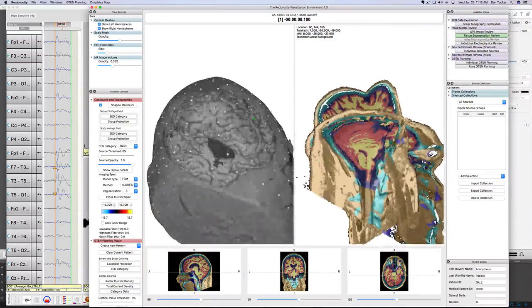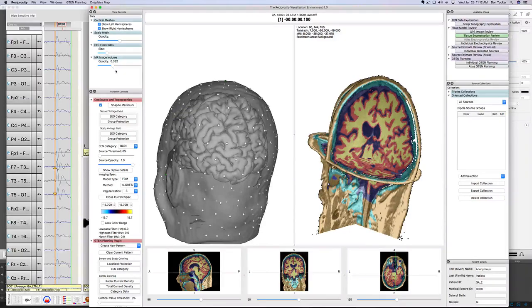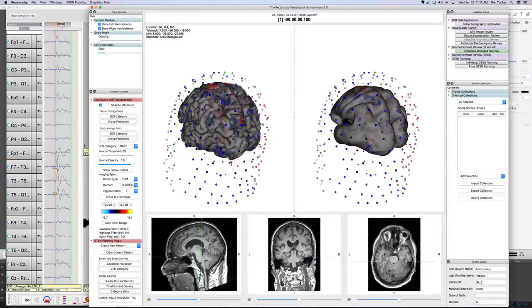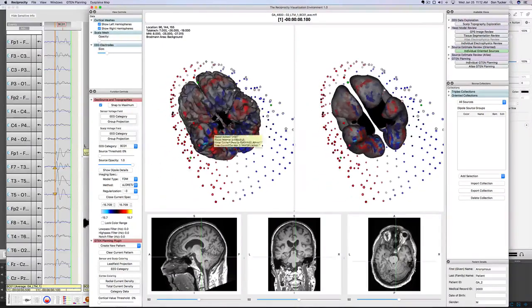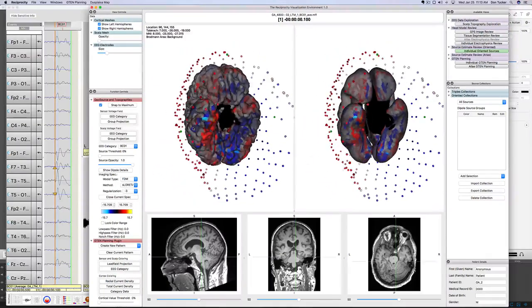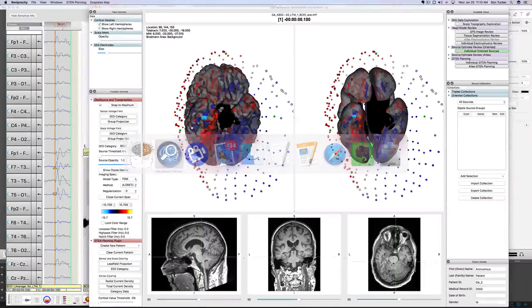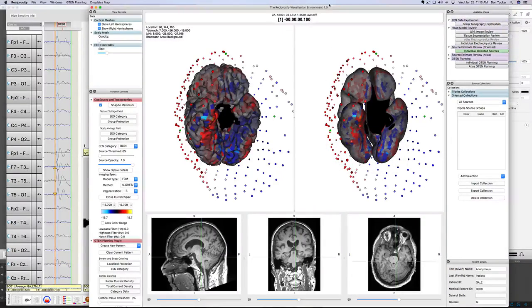the brain. Once we validate the tissue segmentation and the exact electrode positions, we can then go in to look at the localization, the inverse of the surface EEG as it's generated inside the head. This allows us to look at the dynamics of the epileptiform activity in specific brain regions. So we'll go back to the plot and we'll look at the same spike progression, but now instead of only looking at the surface, we'll look at its activity inside the head.